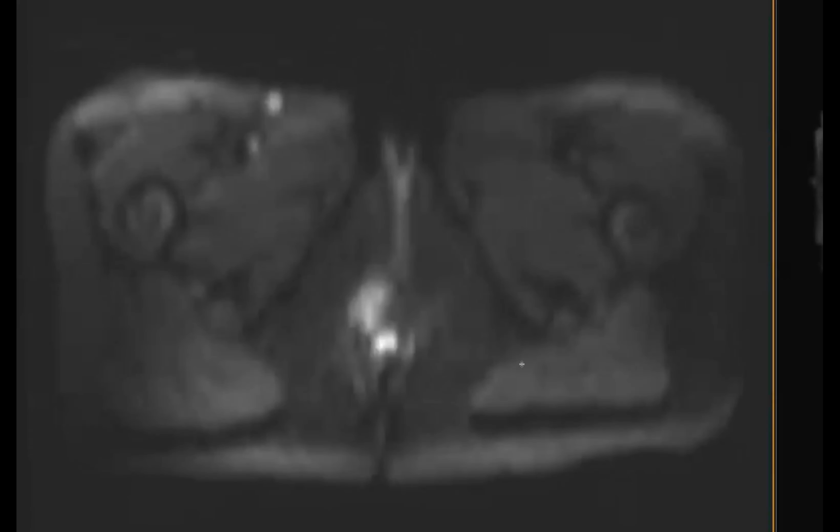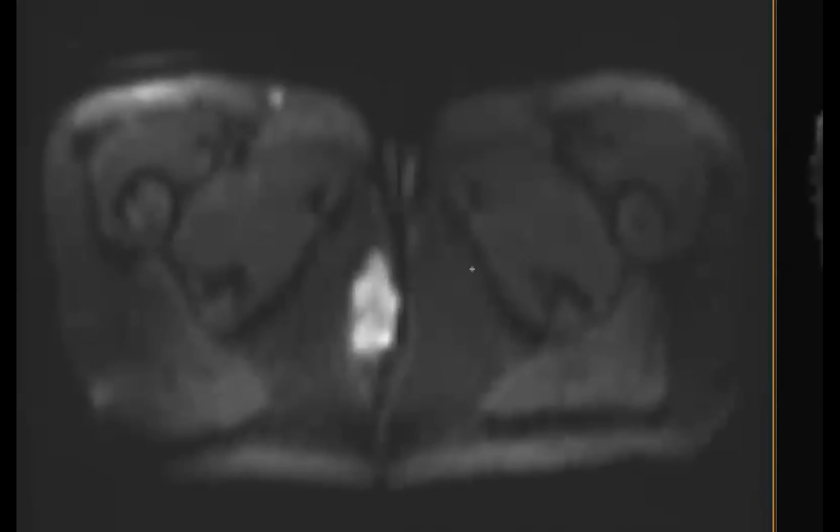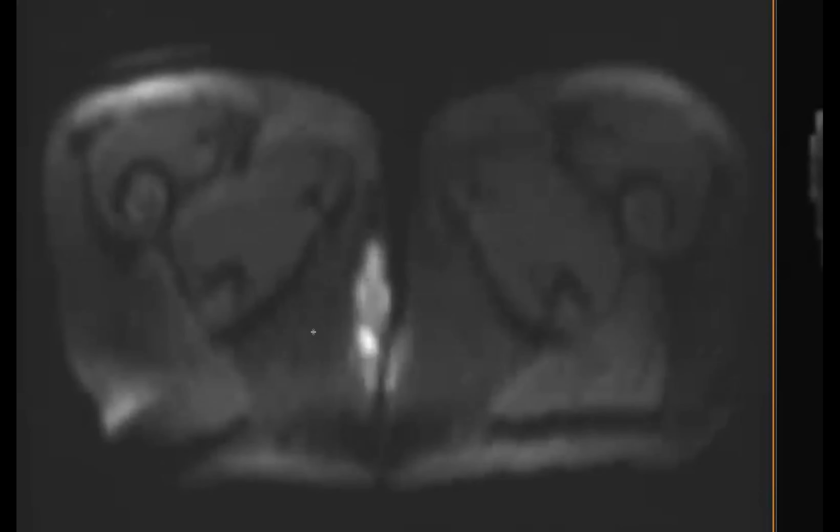This was indeed a mucinous adenocarcinoma, not to be mistaken for an abscess associated with perianal fistulizing disease. So I was trying to teach myself, how can I distinguish and not make that mistake? If you look at the DWIs, this is the diffusion signal here in this lesion, and look at the ADC. There is no diffusion restriction, and traditionally we are always taught to look for restricted diffusion in abscesses, and then the enhancement pattern as well.